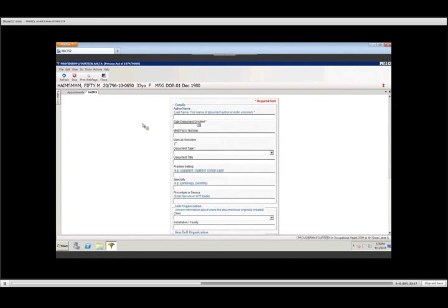Now this is a very, very important screen because what I fill out here will determine how easy it is for me to search and filter for the document in the future. Again, there are 4 required fields. The first required field is the patient's name. Since I'm inside of AHLTA, I already have the patient's name here in the patient bar.